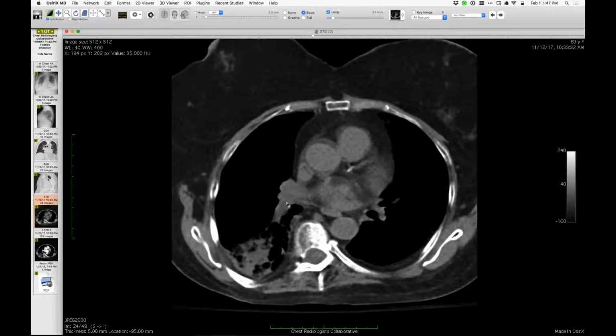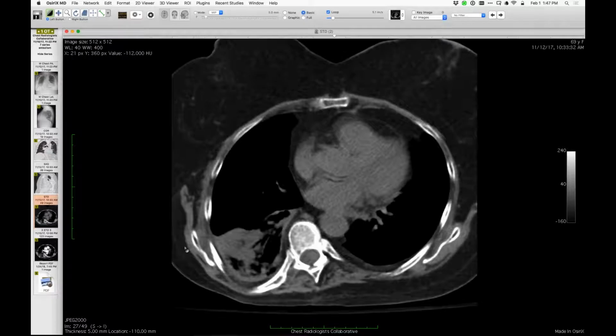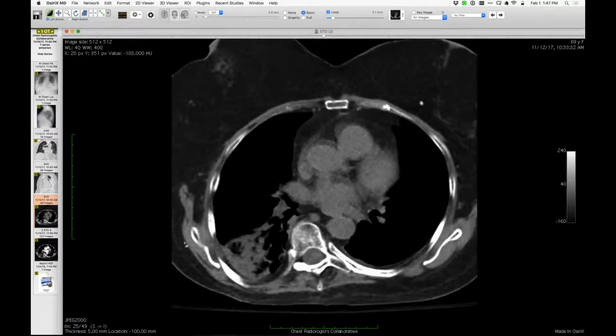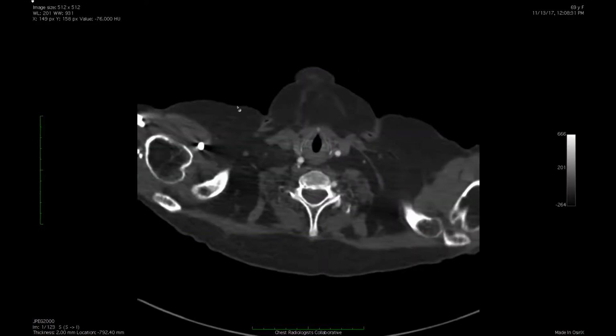But I remember looking at that and looking at this pulmonary artery, and I got a bit lucky here, wondering, maybe it was triggered by the fact that her history and her presentation didn't seem that of someone who was infected that much. But that was the initial read. But as you might suspect, what I'm going to show you next is the CT that was done the next day.